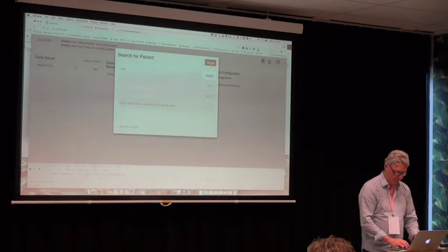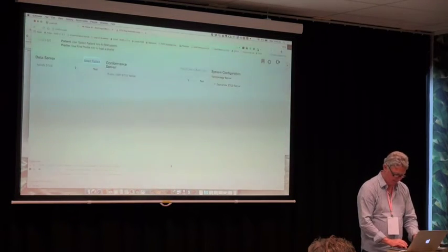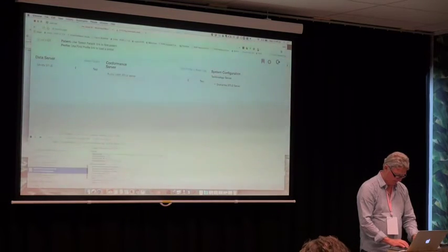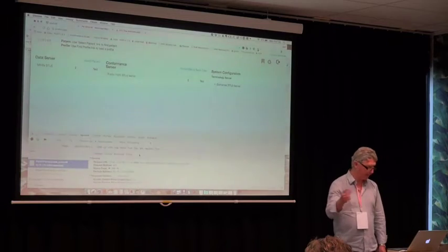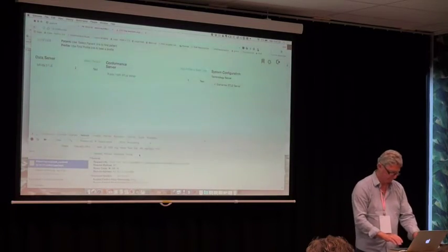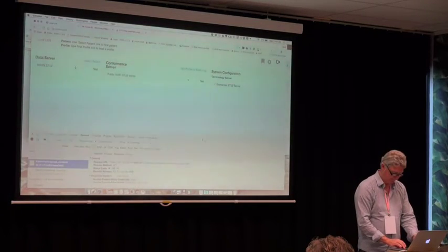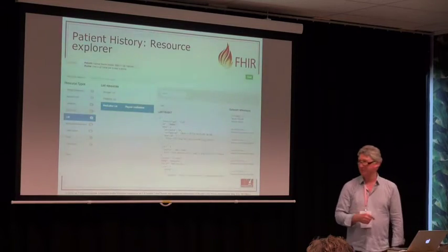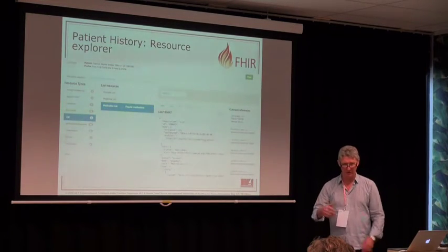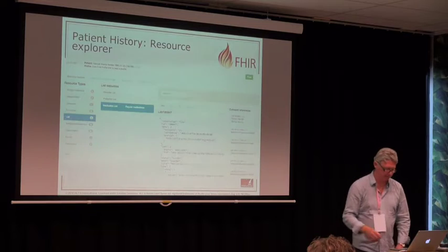Basically, you can use the tooling for, and incidentally, we talked about, so you can see down here, these are the actual queries there, so, boy, you can hardly see that, can you? So that's the kind of query that's being made against that server. Let's just drop that down. And in truth, I probably won't do much more in terms of creating sample resources, but that's what's there.